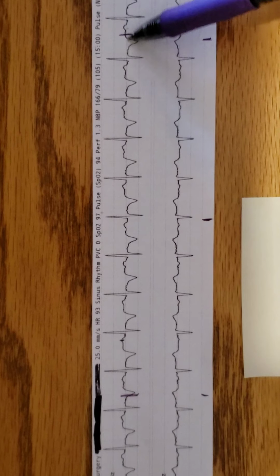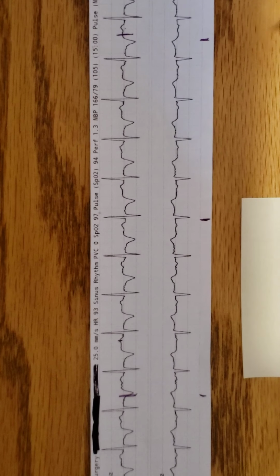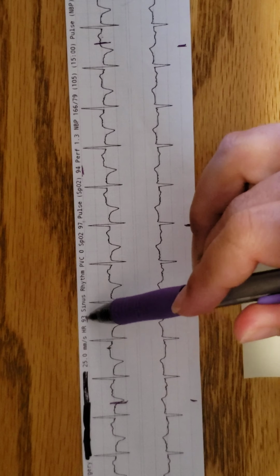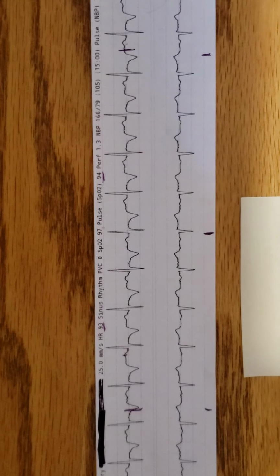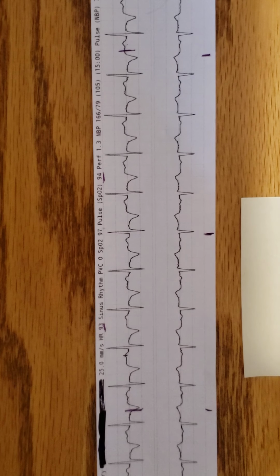I've completed almost another wave here and kind of a piece of one here. So if you want to split the difference, about 95. And that works out well considering they told us it's 94, right? Or 93. So there's counting those pieces. Then we're going to look next. So we've got a regular rate, and we've already figured out what it is. And it's about 90 to 95.